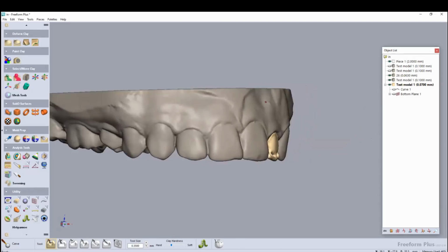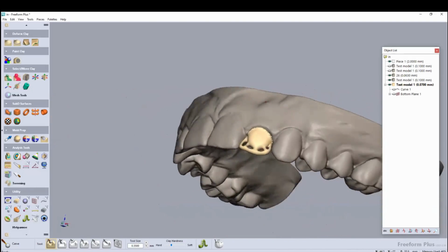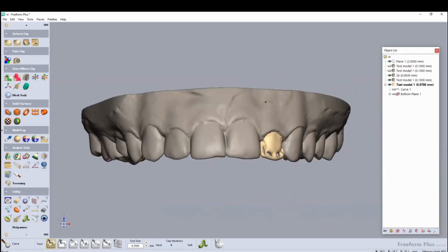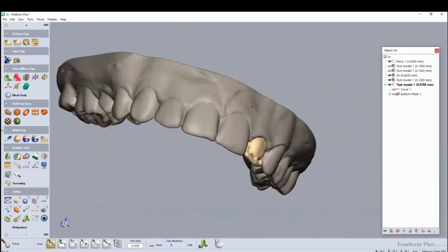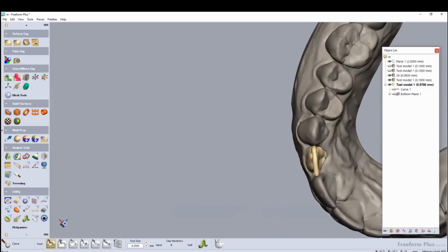Today, I want to show you some simple tasks like creating a crown, and when we make the crowns, I will show you all the basic functions. Maybe some functions I will show you very fast, but in the future we have a 6-day course.